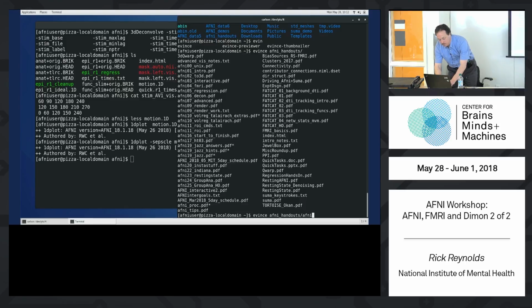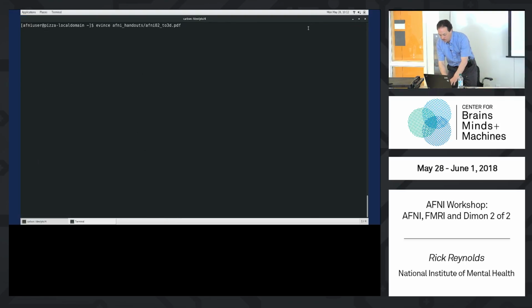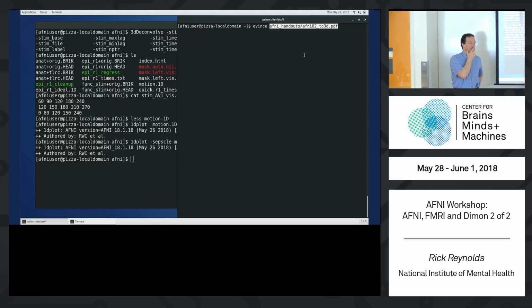I highly recommend using the Dimon software, and if anyone needs this script that we wrote, we'd be happy to provide it. So you can go Bruker to DICOM, but you need this ParaVision thing, which I think might be an option.